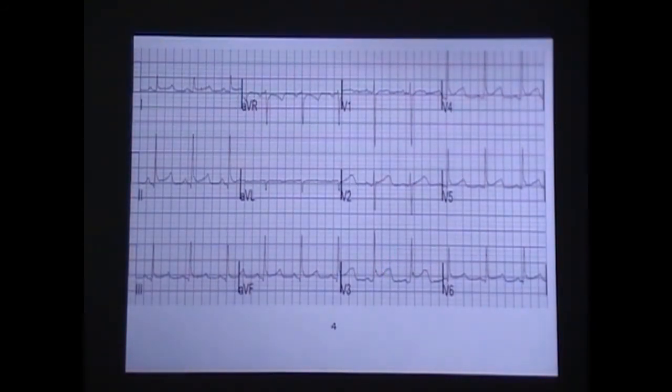So could this be a circ? A left dominant heart. It has something going on from the circ that's affecting the LAD, because you see right here we've got a little bit of something, a little bit there. So this could be a left dominant heart that has things going on from the circ that are affecting the base of the heart here that's showing up. Does that make sense to you guys?